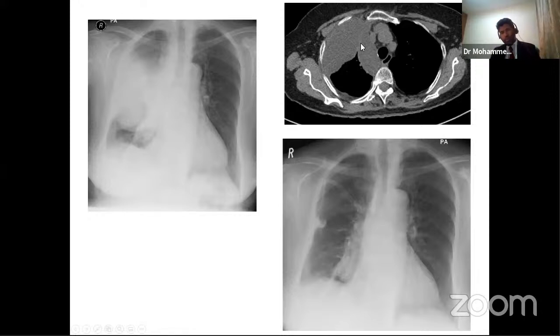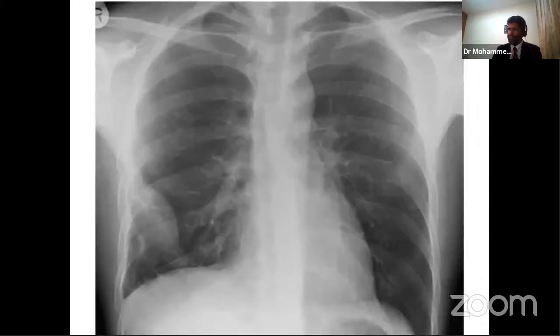And when we're talking about pleural effusions, I would always be worried about two things, either infection or cancer. The rest of the effusions, I'm less worried because most of the other effusions are symptomatic treatment depending on the amount of fluid or depending on the symptoms. The first two things we ought to rule out is it infection based on the clinical history or is it cancer? There is another subtle area of abnormality here.